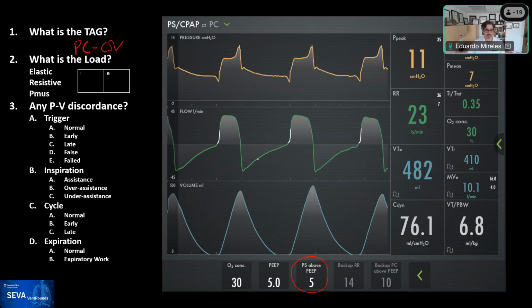Excellent. Thank you, Roberto. So if we think about the load during inspiration, what's the main load here? You got Pmus on inspiration, Pmus. Everybody's recognizing that. And we recognize that because normally, if this was a passive model, what we would expect would be a beautiful decaying curve. And instead of that, we see all this curvature on top, which is consistent with the presence of effort, Pmus, from the patient. And that's essential for us to recognize. Actually, there's been some papers out there incorporating this into algorithms to estimate how much Pmus is present for the patients. And then during expiration, what do you think?